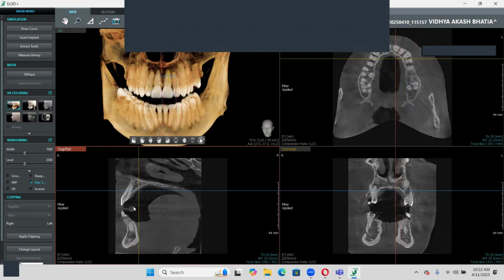You can even see the bite block here. The patient has not bitten on the notch. We can see the positioning. Here also you can see the patient is not centered. There is a positioning error. Usually this plus sign should be here in between the central incisors.